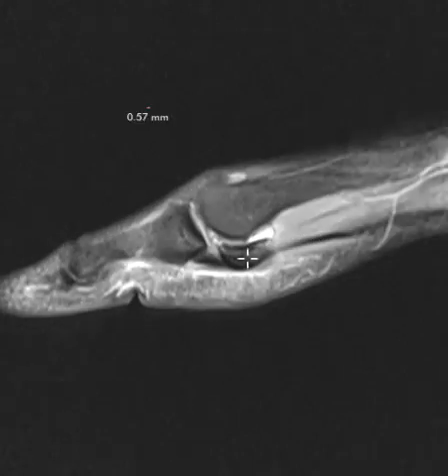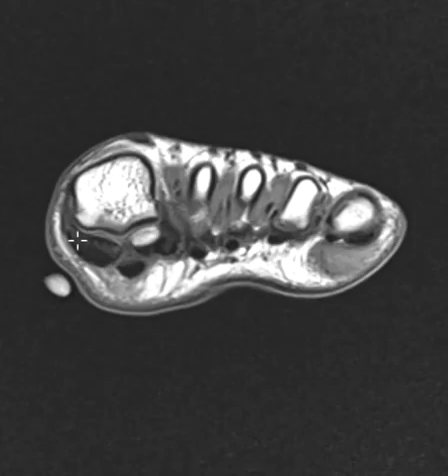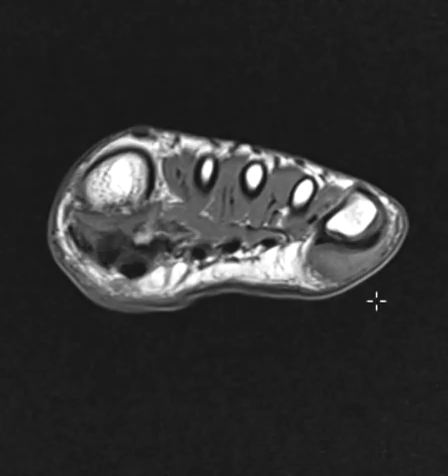So in the end, we're left with an injury of the medial sesamoid bone, a prominent stress injury with reactive sclerosis and a superimposed marrow edema, but no collapse, and edema around it, and maybe a mild injury of the plantar plate, but no plantar plate rupture. And we also have this big pressure lesion beneath the fifth metatarsal head.